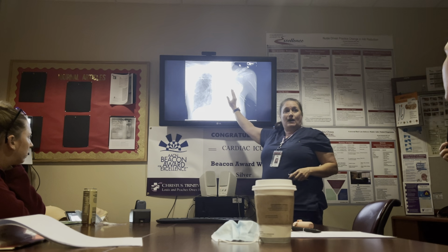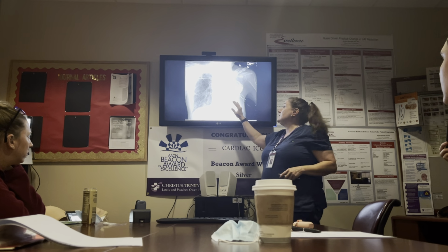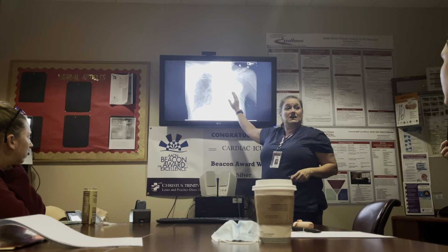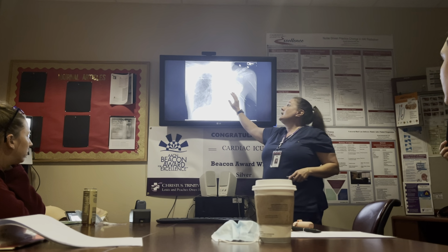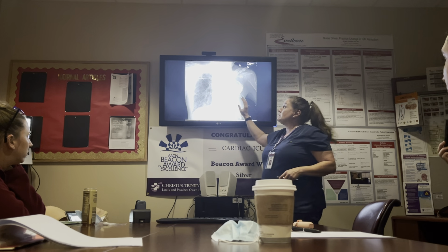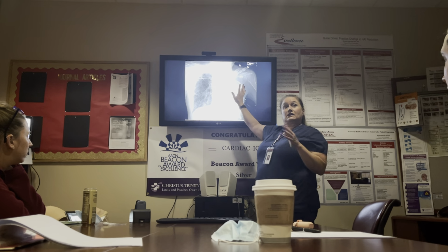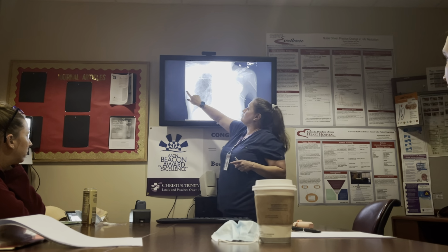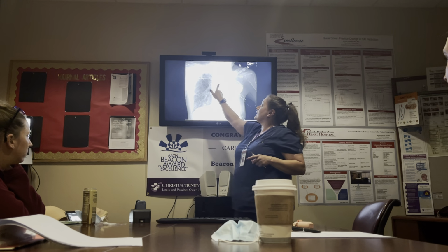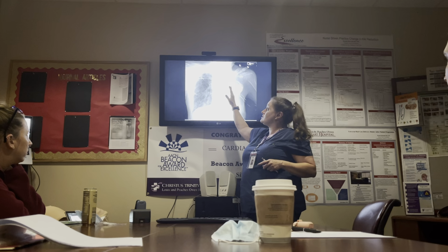This is what's gonna happen as a result of this lung surgery. They may need a chest tube to evacuate, but that may be all they get after a lung reduction surgery, okay? I've seen lung reduction surgeries be better from the aspect where they re-expand and fill the space, but this may be early post-op. Here, I forgot to even mention, is the PICC line. See the PICC line coming down? And you can tell that that whole carina and mediastinum is shifted.